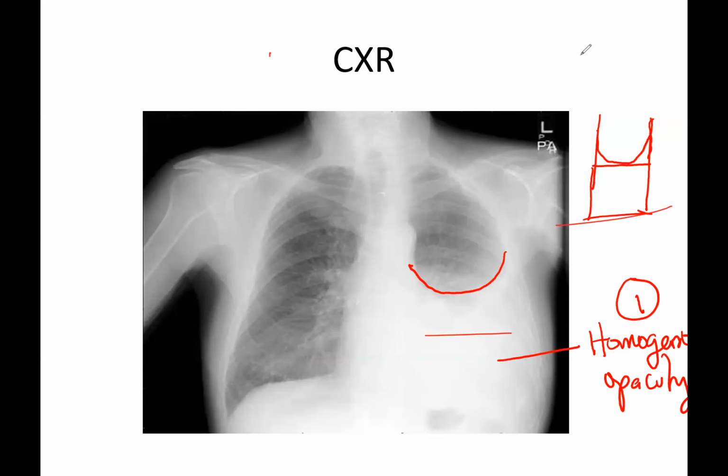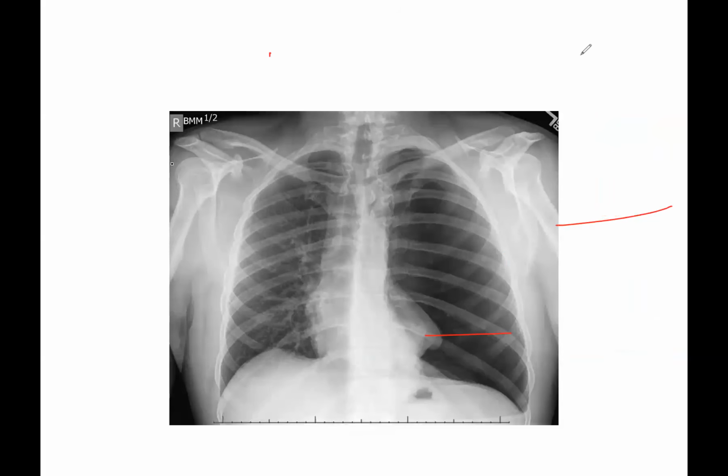Okay, let's proceed to the next image. Now, if you look at this image before I proceed, look at this lung. Here you have lung markings.